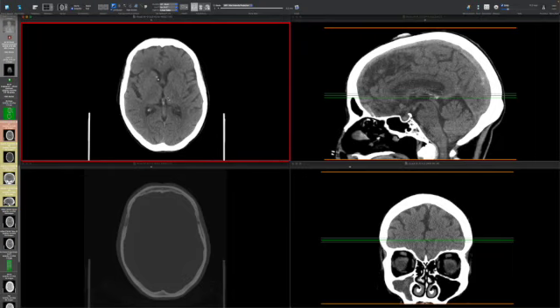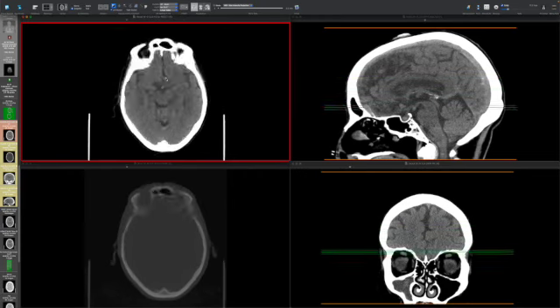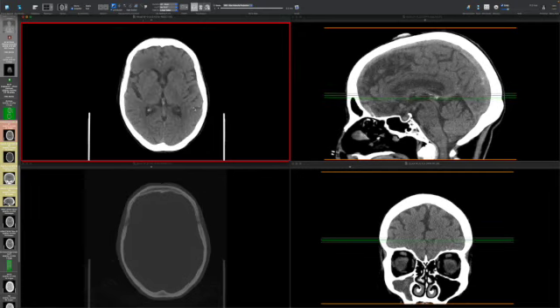You can see here's the head of the caudate nucleus and the putamen, and then you can see the white matter tracts running in between. This is the anterior limb internal capsule, genu internal capsule, and then the posterior limb internal capsule runs back here. So we do an overall assessment of the gray-white differentiation within both cerebral hemispheres. We pay special attention to the insular ribbons along the insular cortex here. You can see nice cortex, which is differentiated from the external and extreme capsule below.